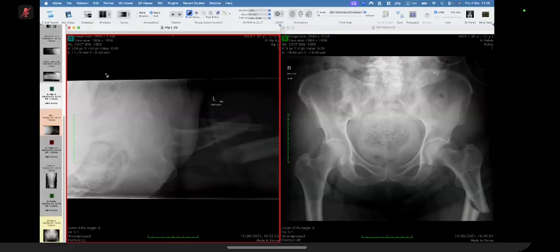Firstly, I'll be talking about the X-ray of the pelvis with bilateral hip joints, radiograph of the pelvis with bilateral hip joints. In the given radiograph, I am trying to visualize all the bones, the sacroiliac joints, and the visualized vertebrae. Initially, I can see that the major abnormality is along the left femur, that is the proximal metaphysis of the left femur, where there is a fracture, a displaced fracture involving the proximal metaphysis of the left femur.